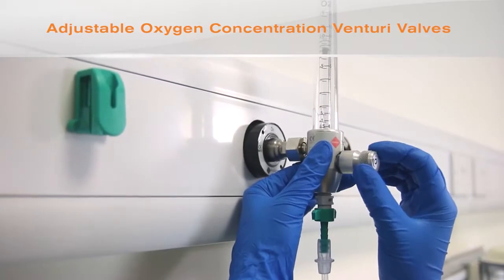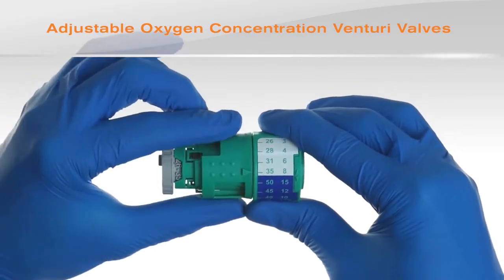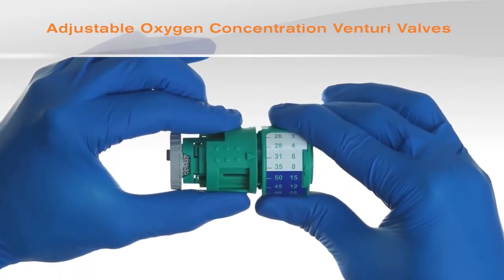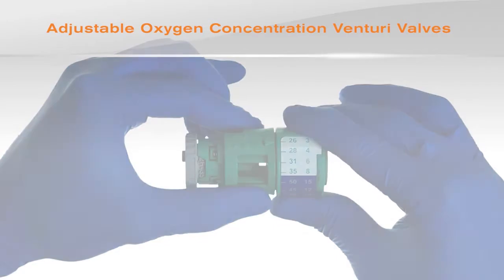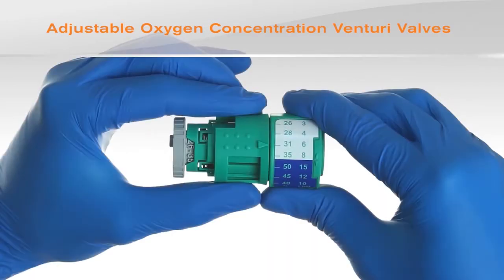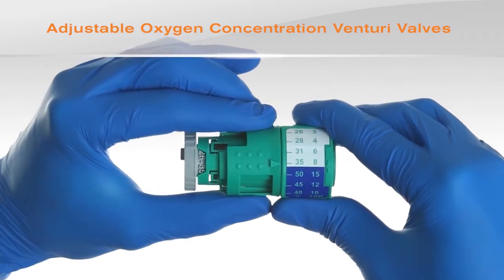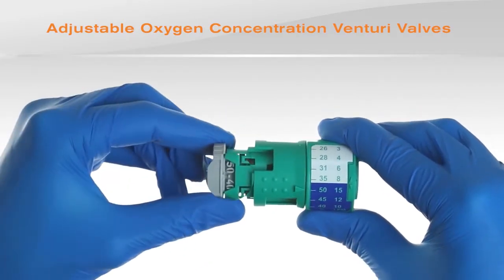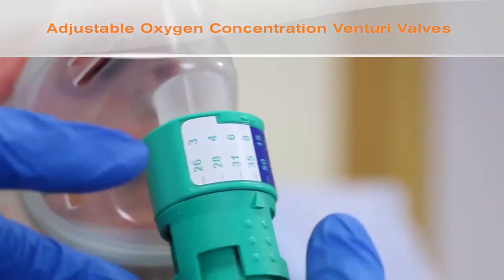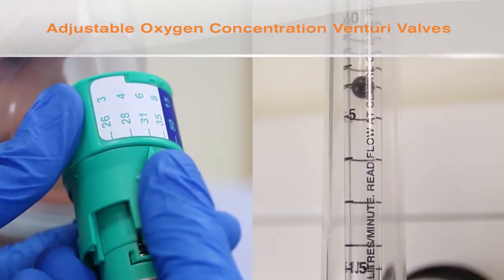To select the desired oxygen concentration, ensure the range selector sleeve is in the appropriate position. If the desired concentration is between 26 and 35%, then ensure the oxygen range selector is set to 26 to 35. If the desired concentration is between 40 and 50%, rotate the oxygen concentration selector to 35% and then pull and rotate the oxygen range selector to select the 40 to 50 range. Select the desired oxygen setting by rotating the oxygen concentration selector. Set the oxygen flow meter to the flow indicated adjacent to the oxygen concentration.